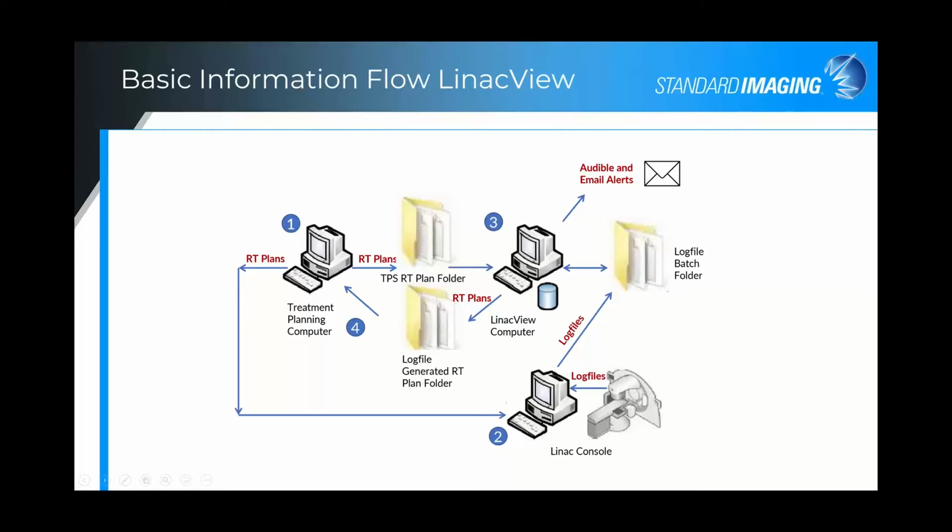You can see on a fraction by fraction basis within your treatment planning system what differences may have occurred during the delivery other than what was planned. Or alternatively, one can send those automatically generated RT plans to an independent dose calculation engine. I would say that one of the advantages, though, in calculating back in your own treatment planning system is that you're separating sources of errors, because in the delivery, you want to be QAing the delivery itself.